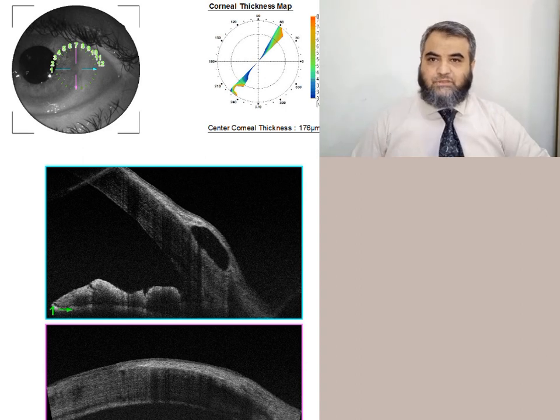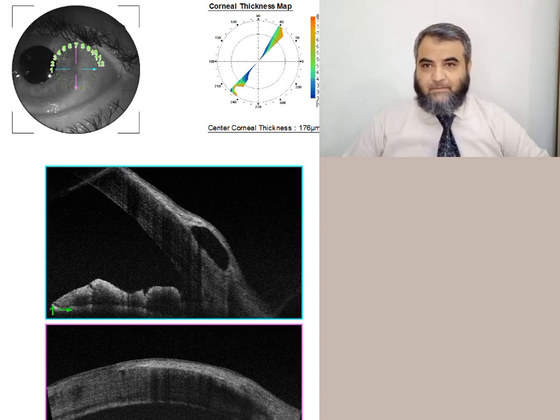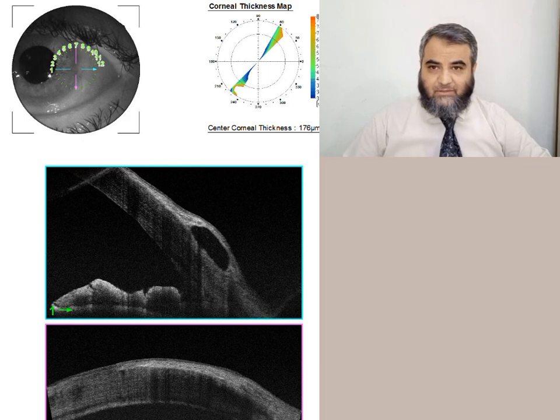Yes, this is the OCT anterior segment. Here you can see the elevated lesion, a conjunctival papilloma, and it is focused infratemporally. Apart from that elevation, you can see small vascular cores over there.